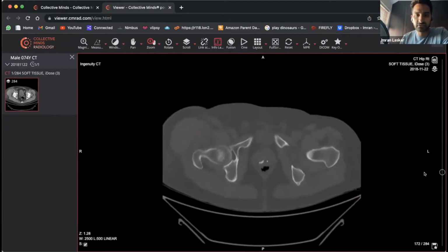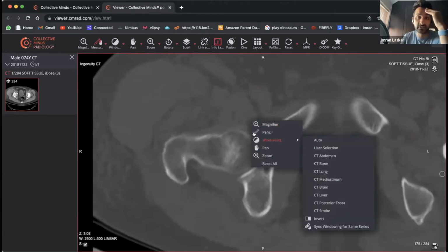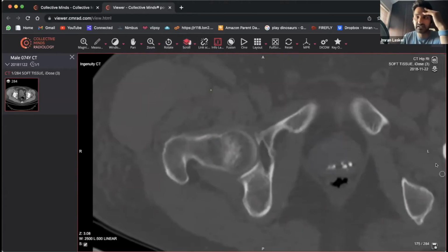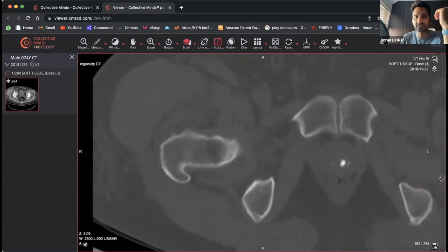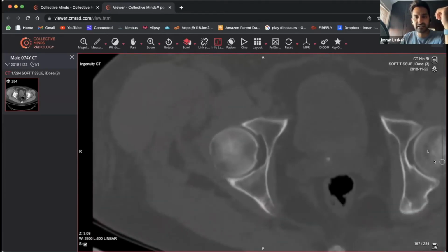So you scroll through, and especially with the neck, you've got to be really careful when you zoom in. There are fractures that are obvious, like you're looking at a proper discrepancy. But sometimes you get a slightly increased sclerotic line going like this, and that's a really subtle impaction fracture. I missed one once actually. We had to do an MRI scan, and the MRI showed florid edema within that region. You go back to the CT, there it was, a subtle fracture. But here, I can't convincingly say I can see a fracture.